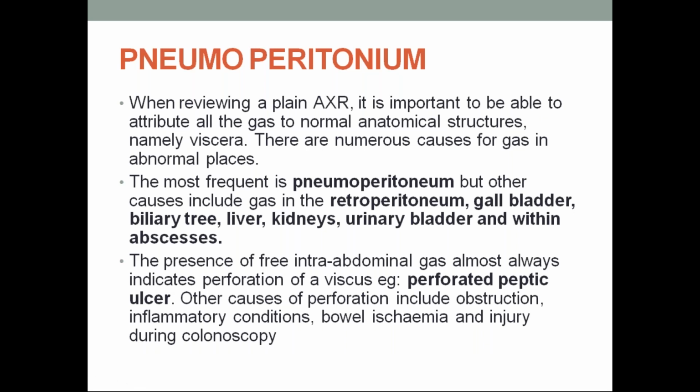Coming to the pneumoperitoneum, today I will discuss only pneumoperitoneum for you. When reviewing the plain abdominal radiograph, it is important to be able to attribute all the gas to normal anatomical structures. Normally viscera, I have already shown you; there are numerous causes for gas in abnormal places.